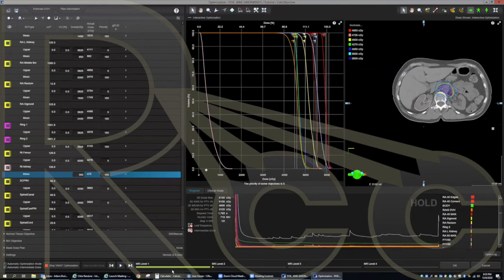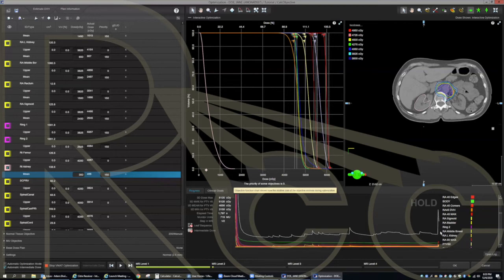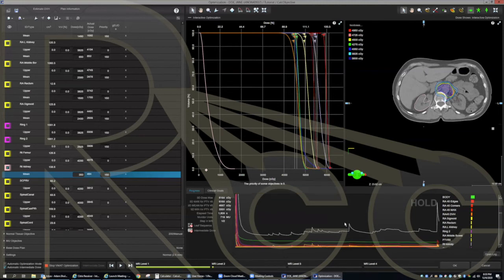Okay, here, jump to step 2, much more degrees of freedom. Again, it's doing this interpolation and then fine-tuning. So we'll let this level out. I'll fix a few of the more max dose-like things. Same thing for max doses.